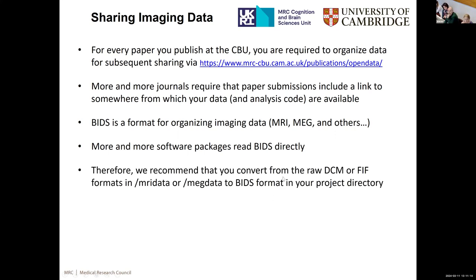And that's why we recommend that you convert the raw data, which is DICOM in the case of MRI, or FIF files in the case of MEG, that are dumped into the MRI data or MEG data folders when you do the scanning experiment. That's the raw directory folders here at the CBU. The first step you do before you do anything else is convert those files into BIDS format in your local project directory.